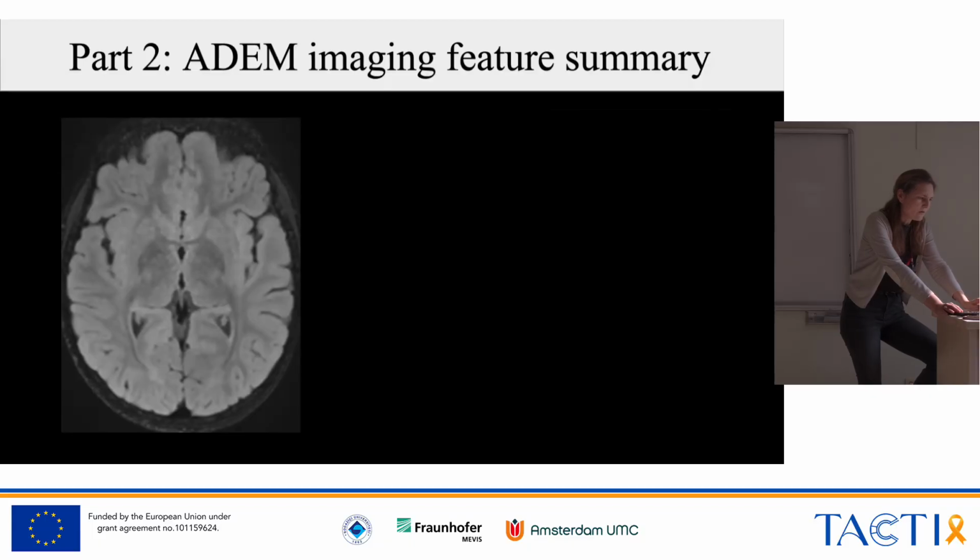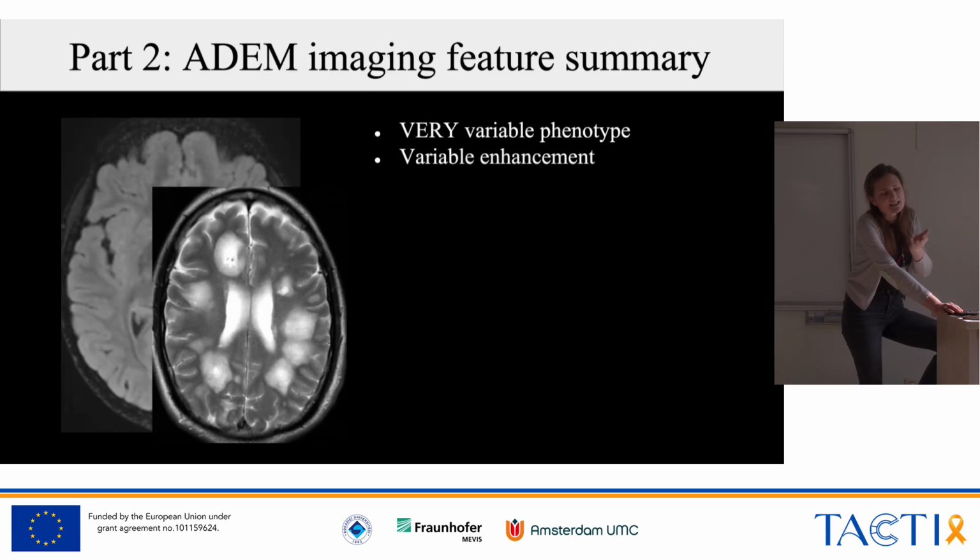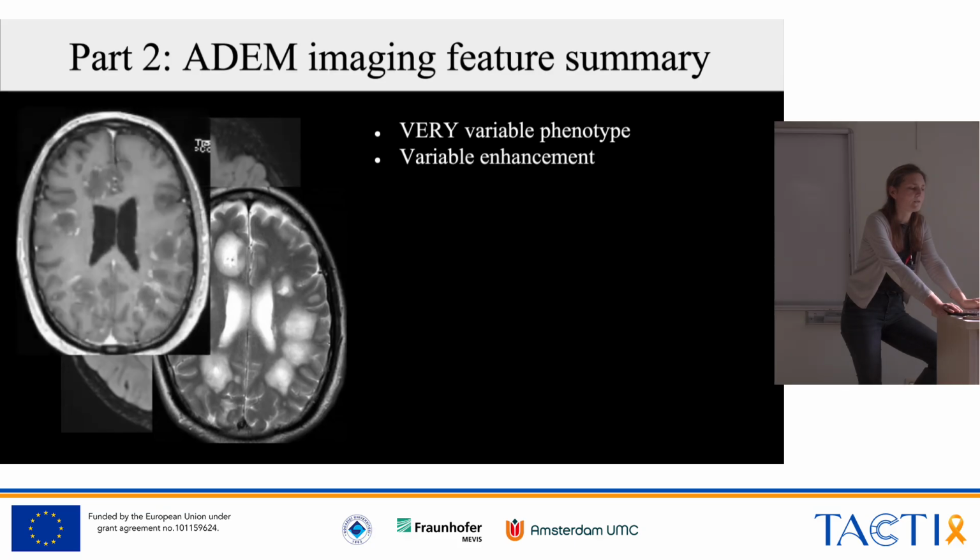There is also a complete resolution of lesions over time to be expected. But, as I said, the phenotype is very variable and there can also be complications from normal ADEM. So what we see is also very much stronger cases, like this is a different case with a lot more edema. And those stronger cases also have, by tendency, more enhancement than the very subtle case I showed you a moment ago, like here, for example.